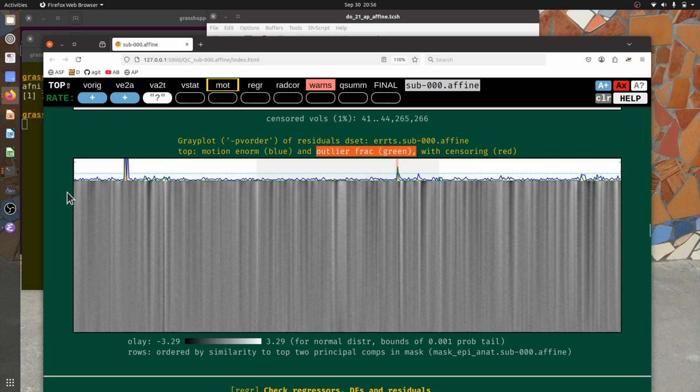The gray box here is, instead of looking at the time series response like we normally do with a graph as an up-down line, with time horizontally and something going up and down like in this upper plot, it's still time along this axis. So this is still the start of our scan and the end of it, actually the end of the 3rd run here for the session.